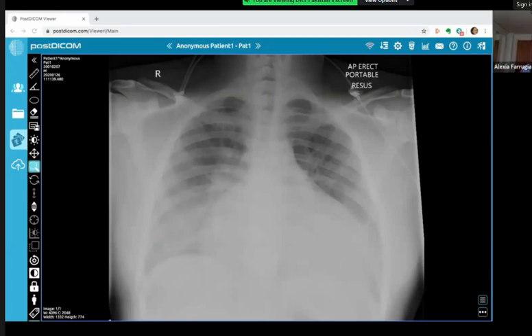So what would you do? In a 19-year-old, having this large heart is quite rare, abnormal. So I'll be thinking if he has any previous congenital condition, like a septal defect or something, which has given that enlarged heart appearance. I would relate it with any clinical history in the background, just to check for any septal defects. However, the opacification on the right side is still odd, and this would need evaluation with CT further to suggest what it could be.